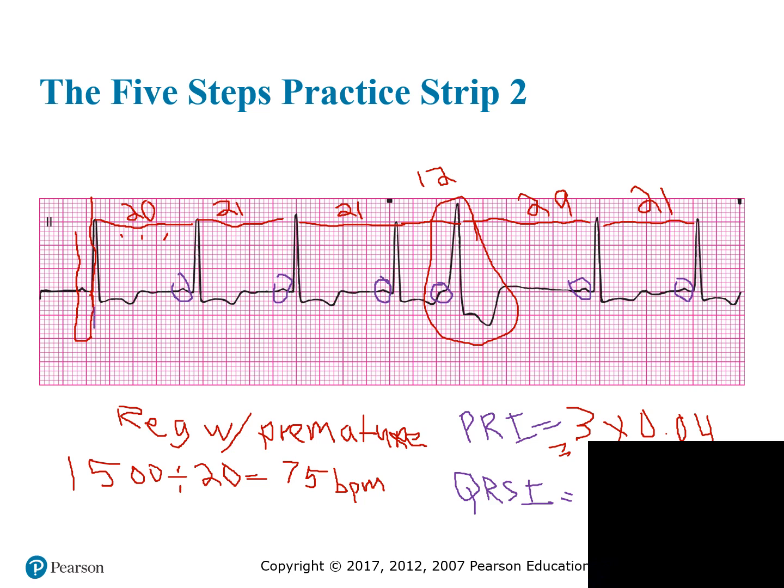We're going to go from here to the end of the S, just before it deflects up to do our T, which is in the middle of a block.